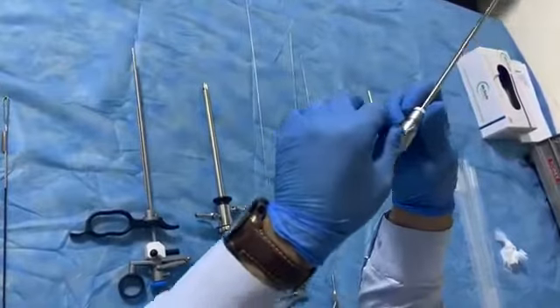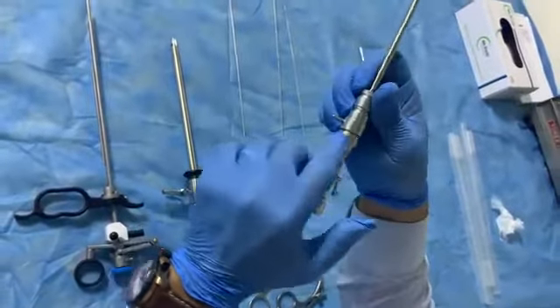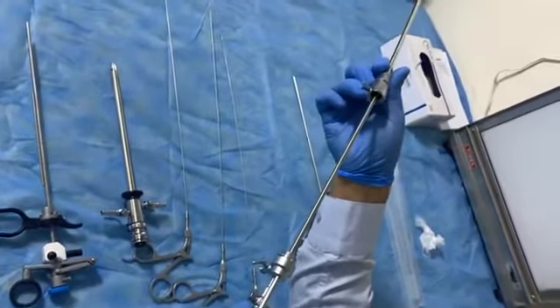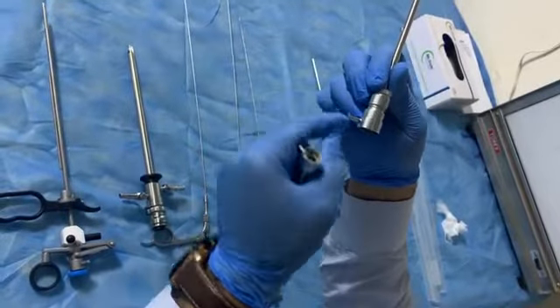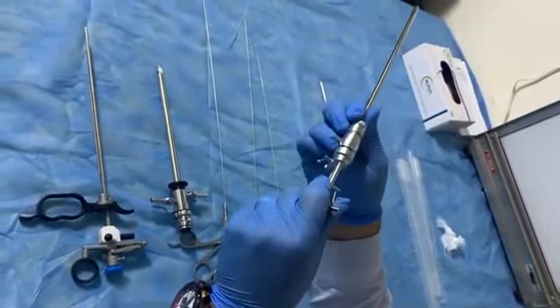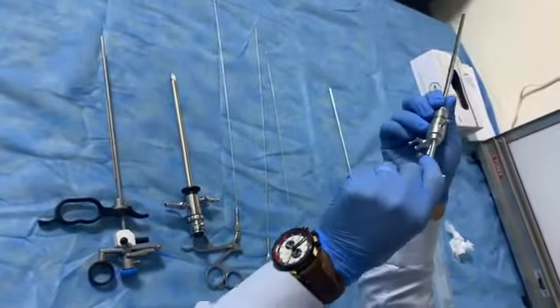This side, we can separate it. Look for this line. This line should be parallel, each one to another one. If it is parallel, it is open and separated into 2 parts. What I want to use, I should put this line parallel to the other, and after that push this part inside. After that, turn clockwise, and it is closed. Now it is closed.